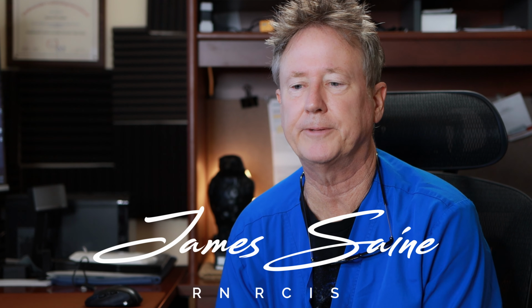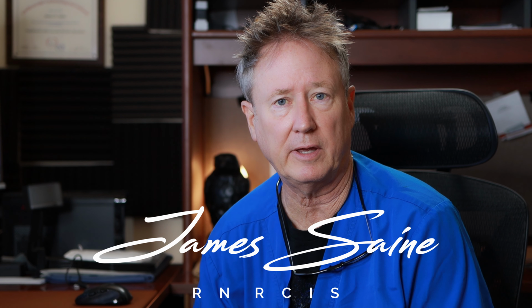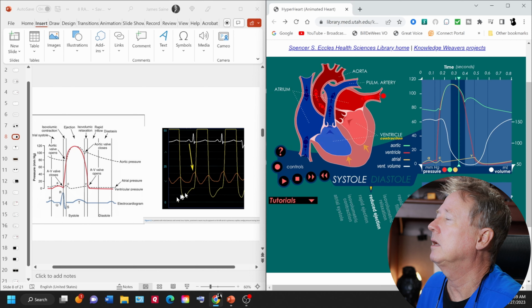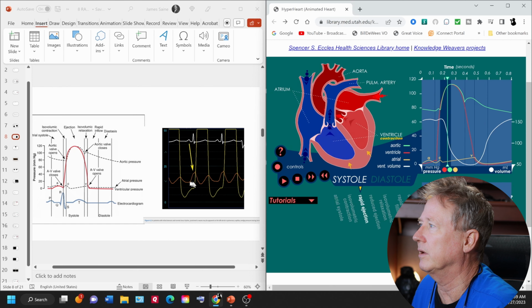Hey guys, James here. So this is a video to clarify when you're doing mitral valve area calculation and why this area here on the screen, this is the gradient area.